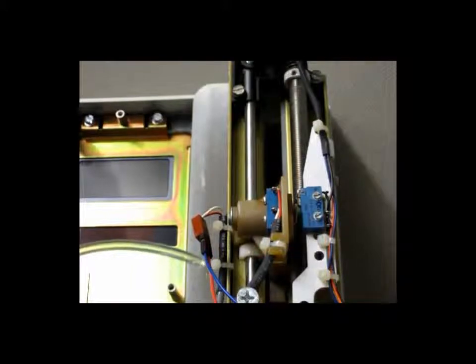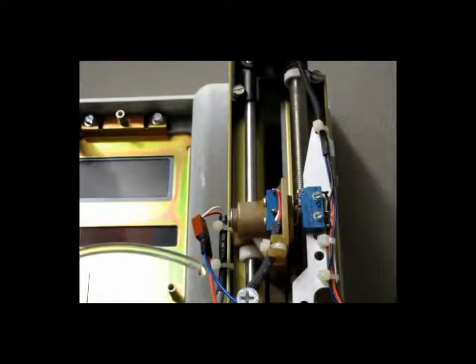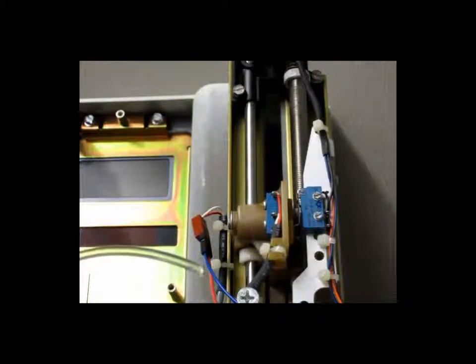Typical PCA infusion pumps have a safety feature that detects empty reservoir conditions. Upon detecting an empty reservoir, PCA infusion pumps are supposed to raise an alarm and stop infusion to avoid hazardous conditions such as underinfusion. Detecting empty reservoir conditions can be done through either mechanical mechanisms or sensors.